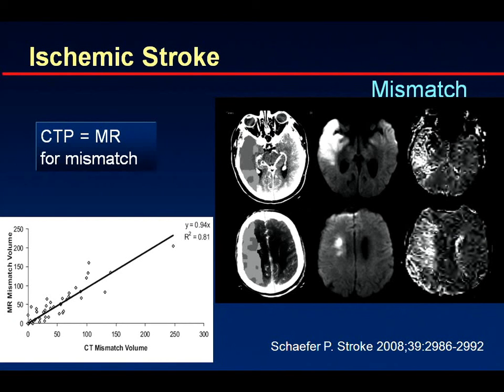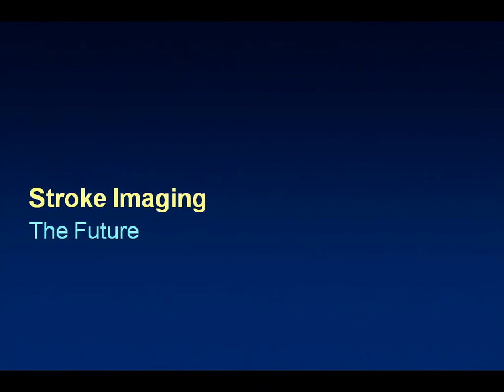So basically, again, both of them give you very similar effects. Here you see the CT, and this is the MR with the mean transit time and the diffusion-weighted imaging. You can see that the diffusion-weighted imaging looks pretty nice, while the mean transit time assessment is difficult, and that has to do with the fact that perfusion imaging on MR is a vast disaster. I thought it was great until I did it myself, so it's really difficult to do.